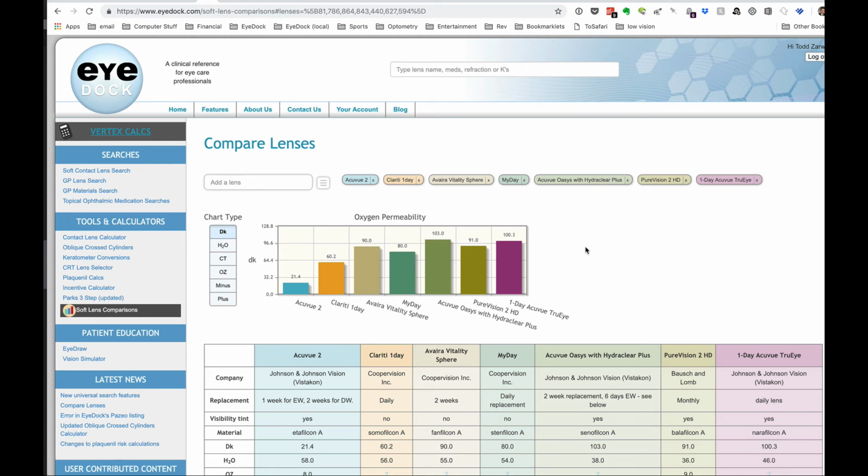I just wanted to make this video short to show off this feature that I don't think I've ever really told anybody about before. So hopefully you find it helpful. I think at some point in the future I'd like to try to add some more things in here, such as retail cost. I think that would be helpful to compare lenses by too.